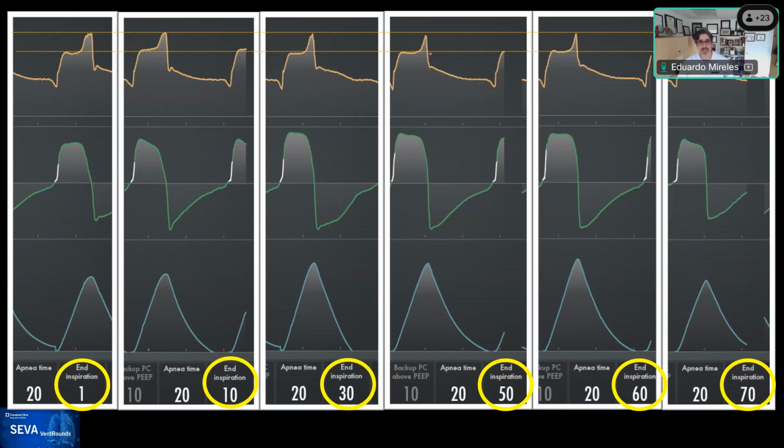However, the tidal volume dropped at that point. So the amount of support. And what I'm not showing here is that the peak of the expiratory flow started to get lost. You can see how it's present at 10, still present. Somewhat starts going away, and then it becomes smaller. So moving between going into an earlier kind of effort, there's still some effort from the patient.